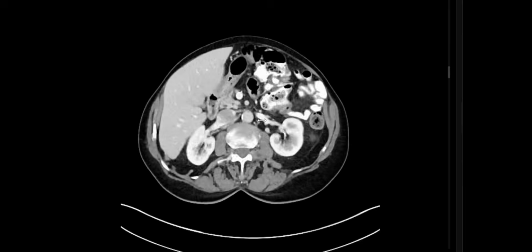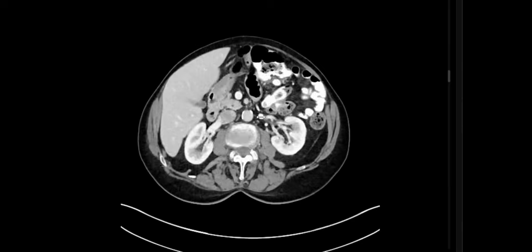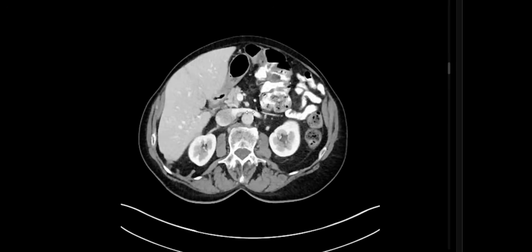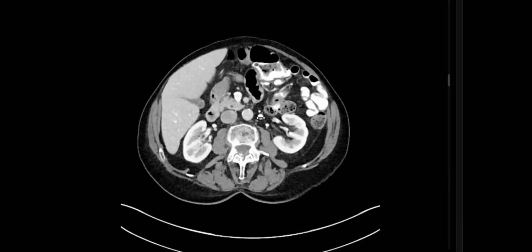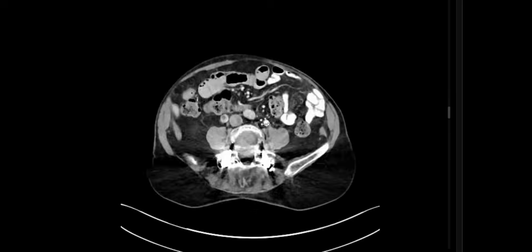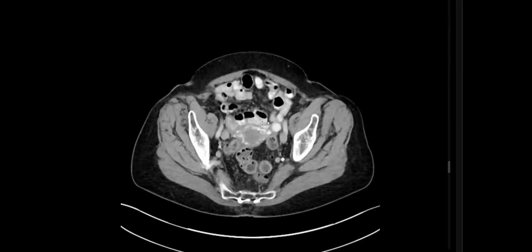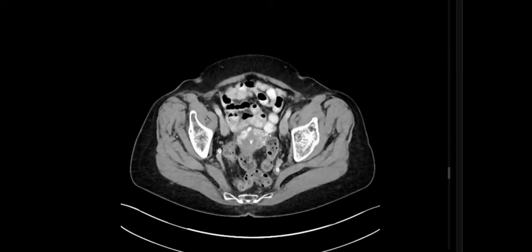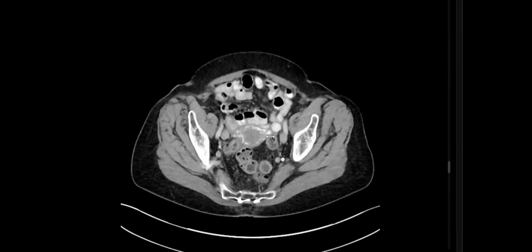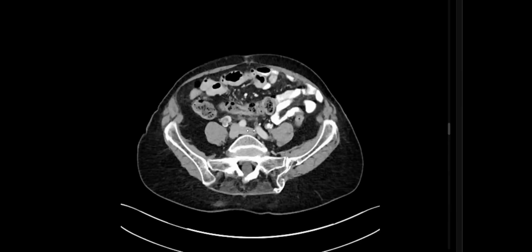What is the underlying pathology? Commonly anterior nutcracker because it joins the left renal vein. But here, no nutcracker, so it's native reflux. It's a primary reflux in the left ovarian vein. If reflux, it will be enlarged and easily seen, with secondary symptoms or signs, engorgement of the pelvic vessels and uterine and parauterine vessels. Another possible cause for pelvic congestion, we have to look at this area.